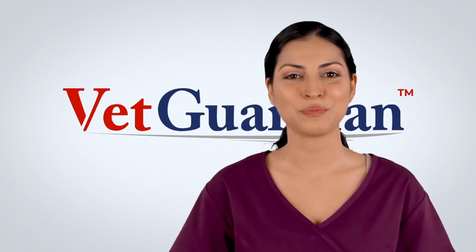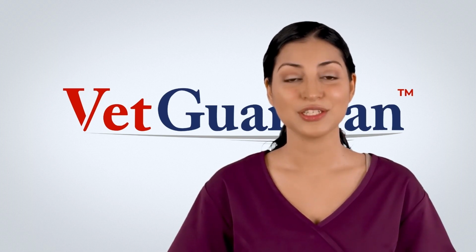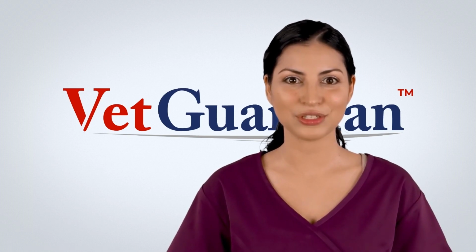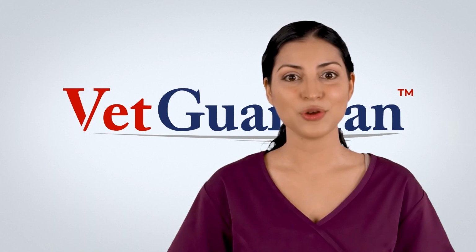In this video, we'll go over the basics of running your first session with VetGuardian. We'll take a tour of the app, learn how to add a patient, configure alarm settings, and more.